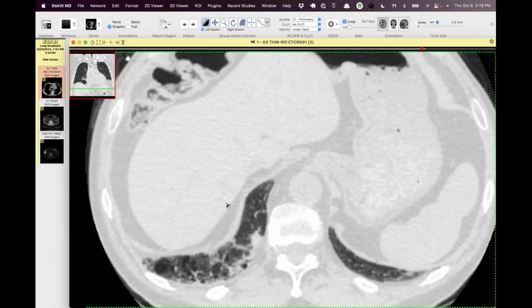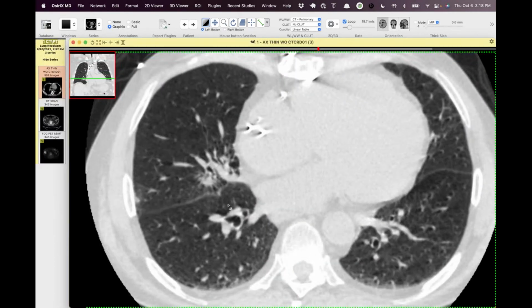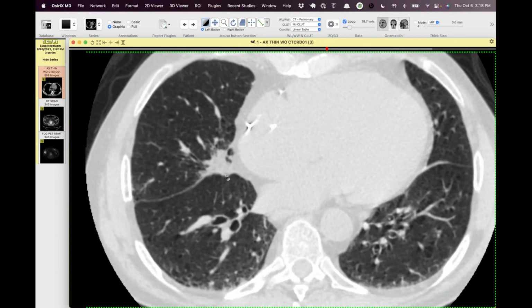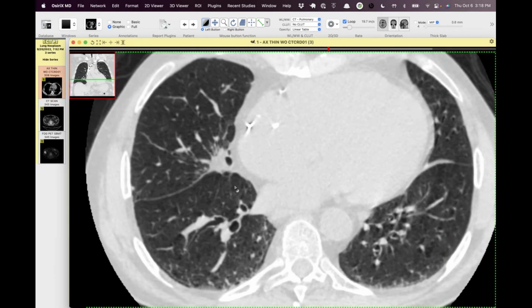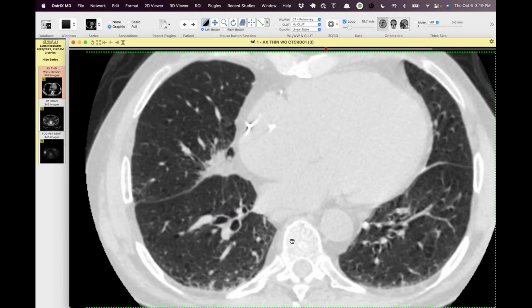I know if Howard were on here, he would mention the rare cases of endogenous lipoid pneumonia or lipogranulomatosis. And if he was on amiodarone at some point, I don't know, but probably there's something that he aspirated. Maybe he slept on his right side because of his heart failure, and that's how they got there. Could be.